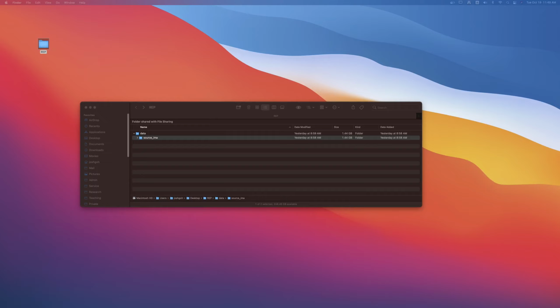Okay, the next step in processing, or rather the first step after we figured out the file structure, the Dicom file structure, is to convert the Dicom files into Nifti files. This Nifti file is the file format that SPM requires.